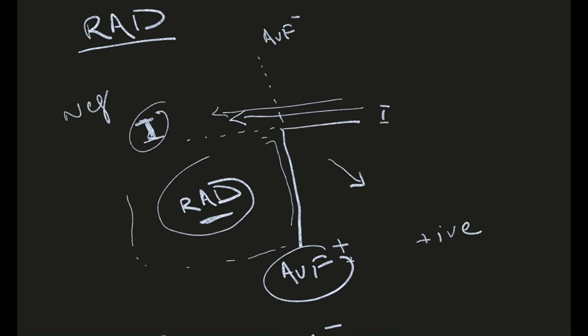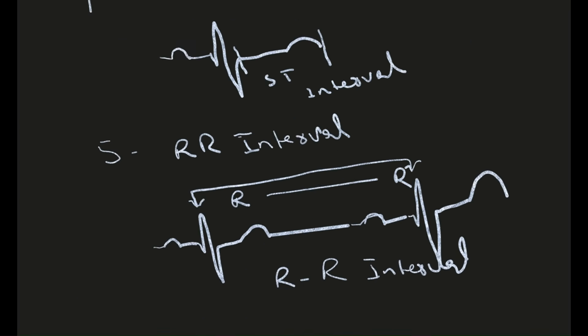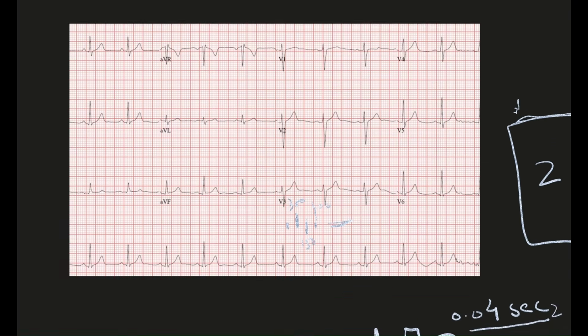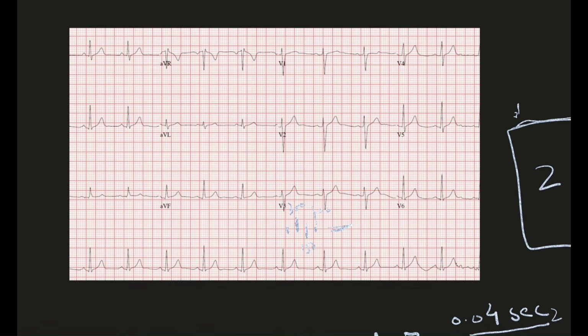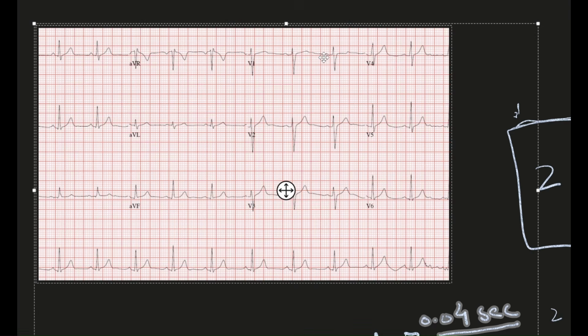Let me show it to you on the real ECG paper. Look, here is V1. Can you see the progression of this R wave?